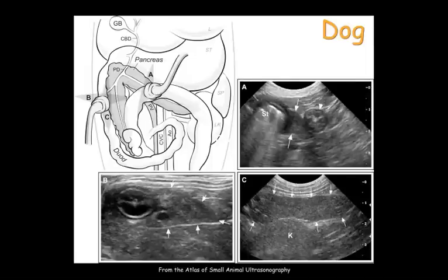On the schematic drawing, the two thin, elongated pancreatic limbs are uniting at the level of the pancreatic body, seen just ventral to the main portal vein near the hilus of the liver. The left limb of the pancreas lies along the greater curvature of the stomach, while the right lobe of the pancreas lies along the descending duodenum.